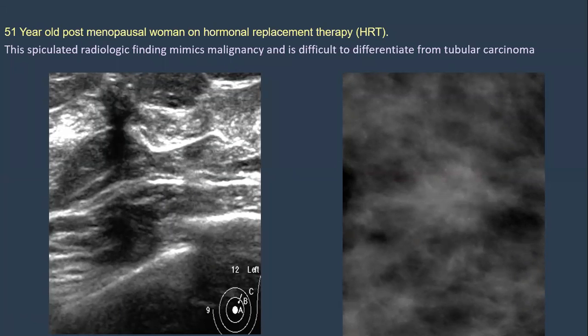Biopsy. What do you expect? This is non-palpable, an incidental finding, either with stereotactic biopsy or ultrasound guided. But it can be done by ultrasound and was done. He had biopsy. But what do you expect the etiology? The pathology tends to be what? From the list we mentioned before regarding the etiology for architectural distortions, what do you expect, benign or malignant?